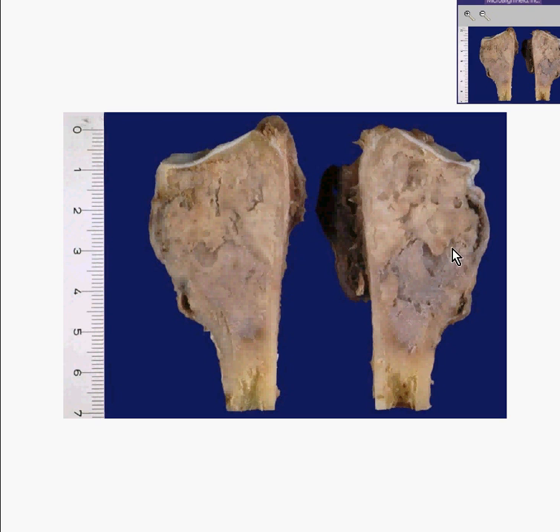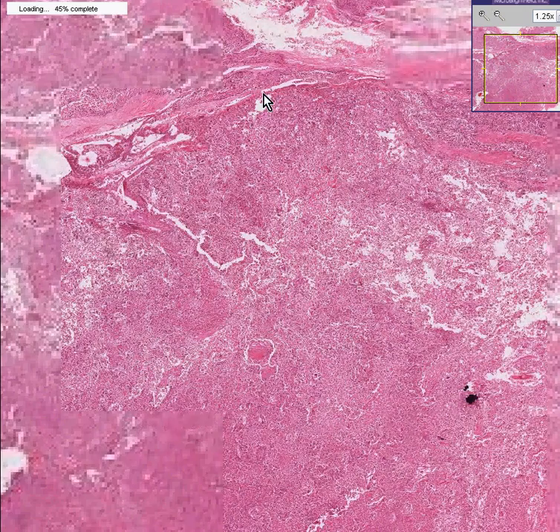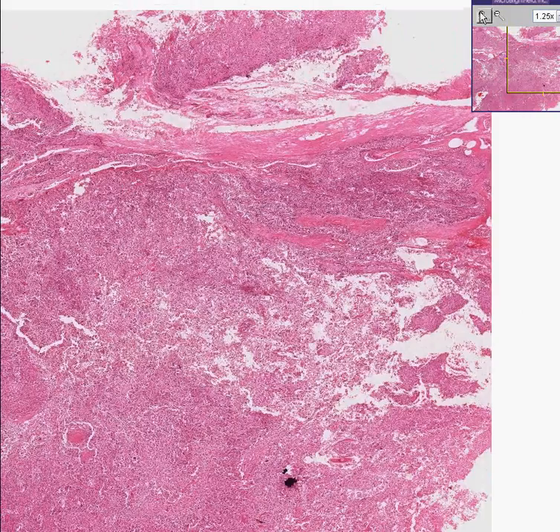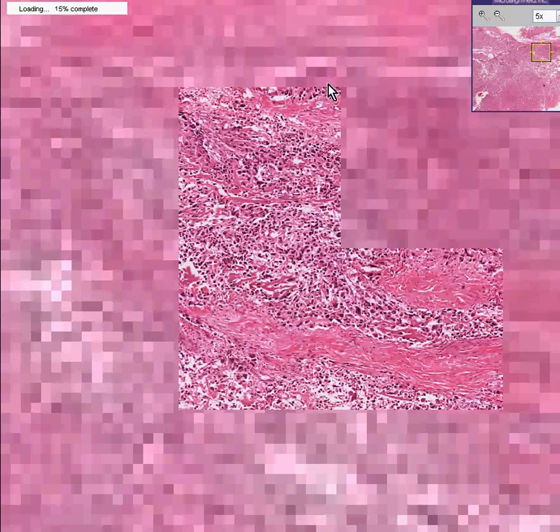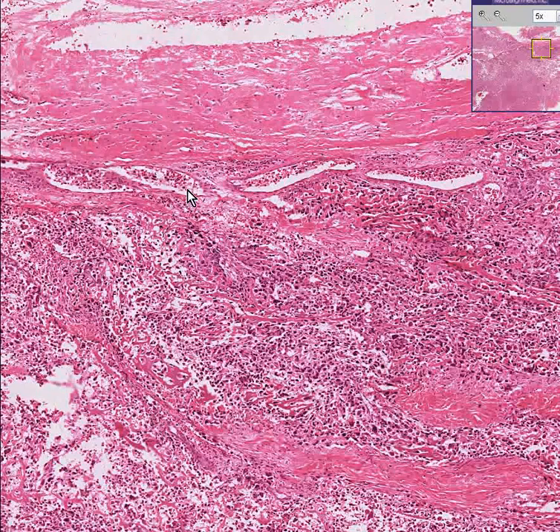If there was still a growth plate, all you see is complete replacement by this irregular tumor destroying cortex. And we saw in the x-rays going out into the soft tissue even as separate nodules, but we don't see it here. Let's take a look at the microscopic view. And once again, you can see, perhaps peripherally, that there might be some remnant of destroyed cortical bone. On the other hand, there might not be much.